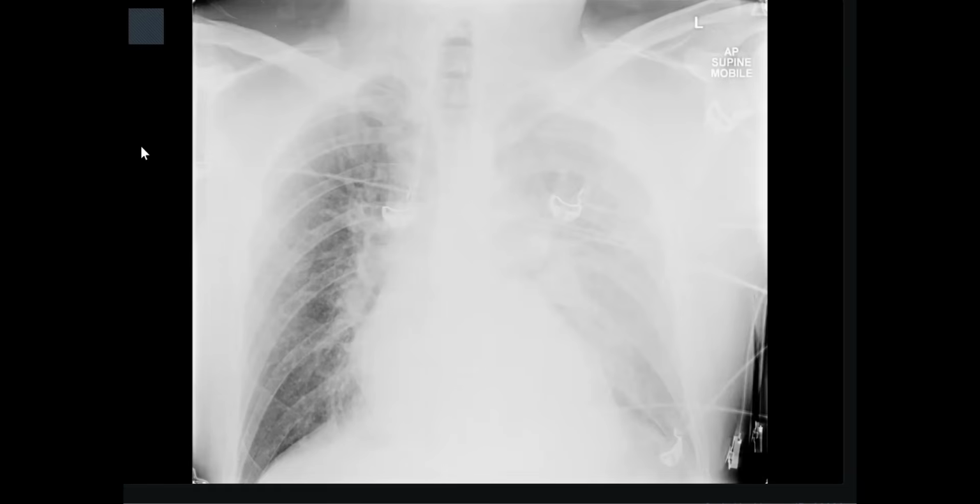Due to left lower lobe collapse. You give me a diagnosis direct. No, I actually retract that. Sorry. Why lower? Because I first think volume loss. Before you give the diagnosis of a lower collapse, mention the signs of volume loss. Okay, yes. I'm hearing multiple signs of volume loss, so most likely it will be collapse.